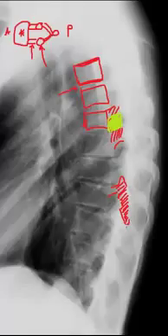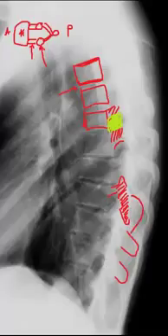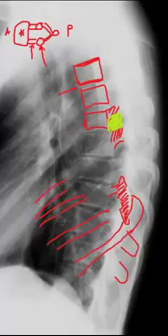We cannot appreciate lamina or spinous processes very well, but if we look ever so closely, we can see a spinous process right here. And can we see any other ones? Maybe right here. So what you'll understand is that anything posterior to the articular pillar is not well seen on radiographs due to these nice structures, which like to wrap around and come anterior. These are the ribs. Now you'll notice there's several ribs here, and one of the dilemmas is that we're seeing both right and left ribs superimposed over each other, and it can become quite a mess looking at the lateral projection.